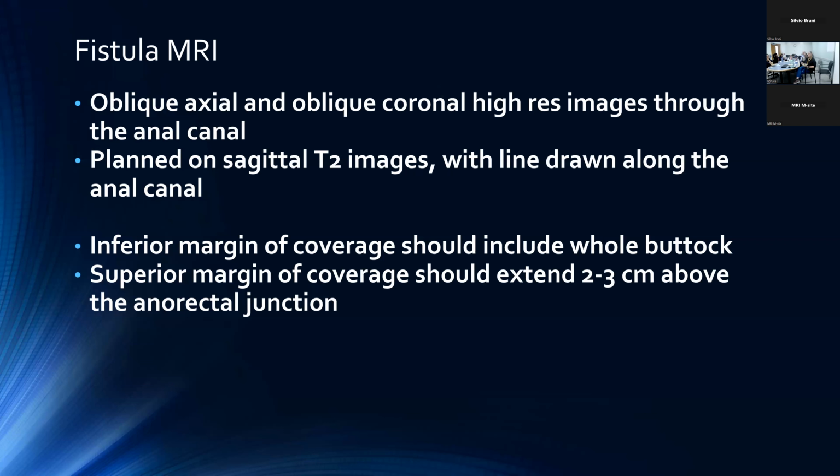In terms of coverage, it's important that coverage for these cases extend from a few centimeters above the anal-rectal junction along the cranial margin. Inferiorly, which is a little bit more important, the coverage should include the most inferior skin surface of the gluteal fold along that caudal margin, just because that's where a lot of these fistulas will extend to the skin surface, and we want to see exactly where the fistula is exiting. So coverage needs to include essentially all the way through that inferior gluteal fold.